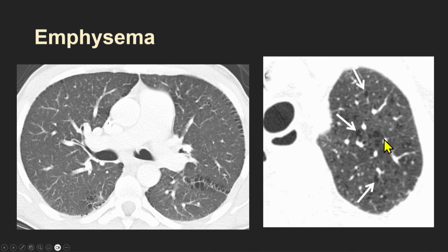lung disease. Sometimes these central lobular emphysema cases can kind of look like cystic lung disease, especially if they've got a little bit of fibrosis or scarring on top of it. We also know that smoking can actually cause a little bit of fibrotic changes in the lungs. And sometimes when you get a combination of emphysema superimposed on this reticulation, a little bit of scarring, it can look like cysts. But most of the time, these areas of emphysema are not going to have walls.